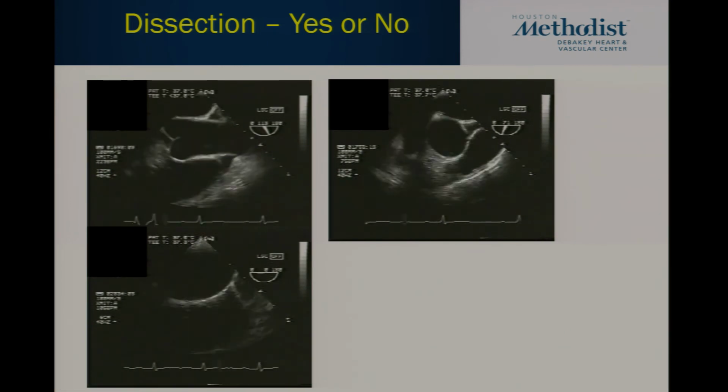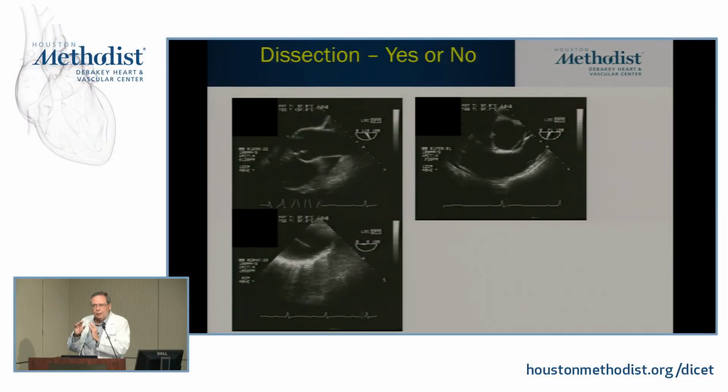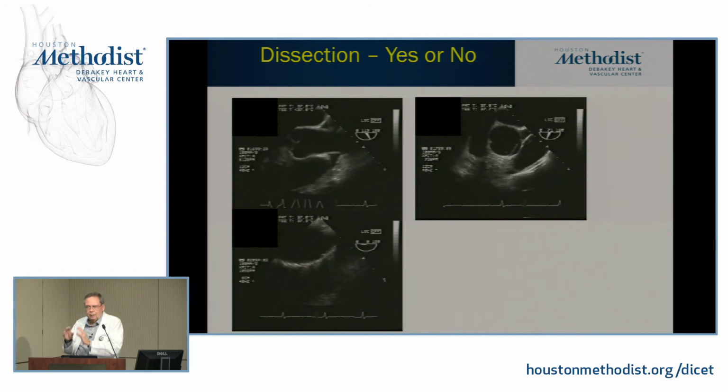Okay? So it's not how bright, how brilliant it looks. It's other features. Mobility, particularly mobility.